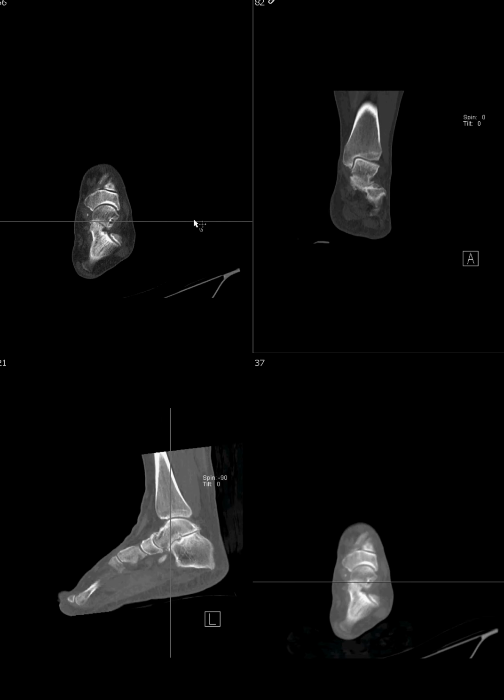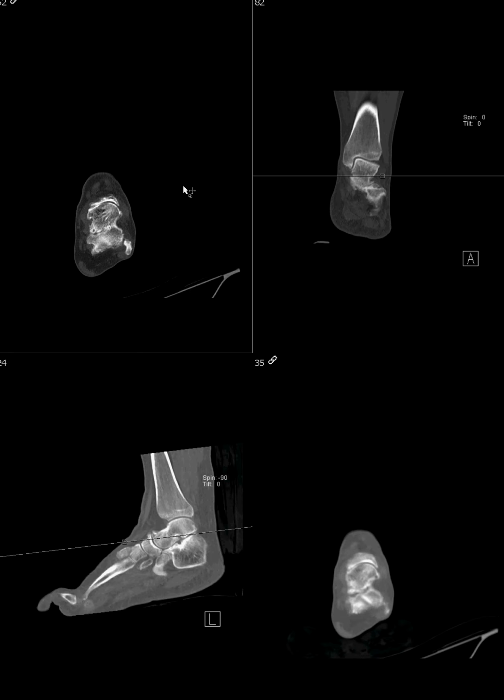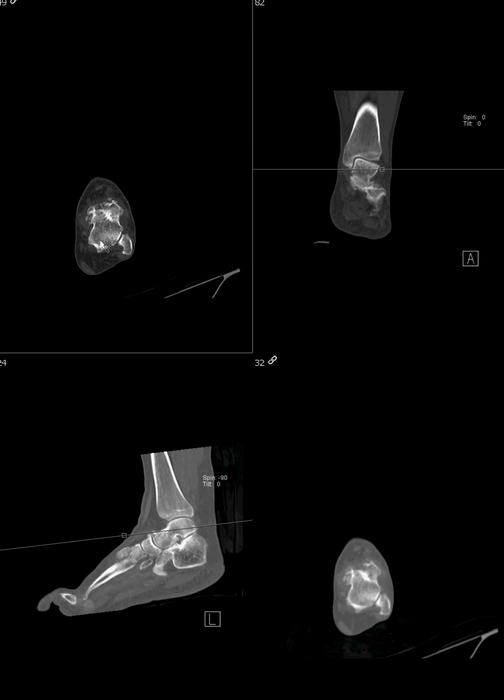the image plane is parallel to the table. And when you look at the sagittal images, you see that the sagittal images are perpendicular to the tabletop. And again, not oriented according to the anatomy that we're interested in. And the problem here was that this was a 2 mm slice thickness. No 1 mm or smaller, thinner slice thicknesses were provided, which makes it difficult to reformat at the workstation.